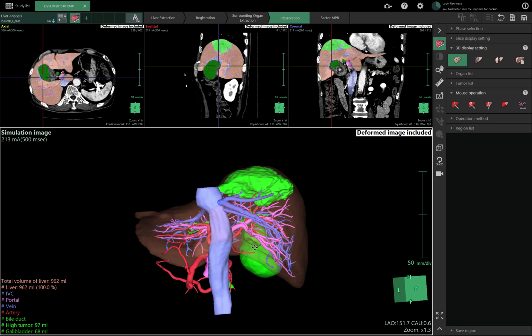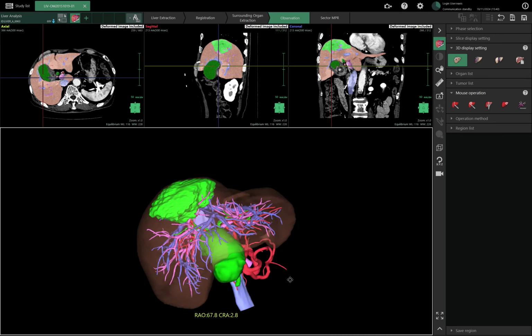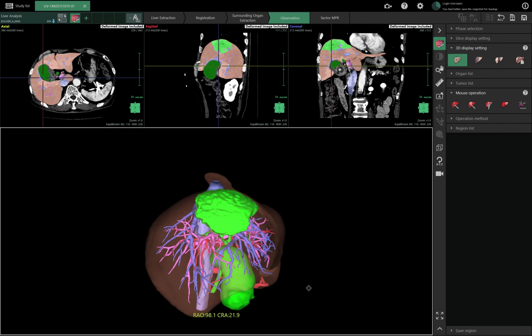Sorry? Yes, yes, yes. Because if you cancel, you don't set root, so you cannot segment regarding these vessels. But in this case, some tools don't allow you to make extractions like the bile duct. And here it is. Here is the result.